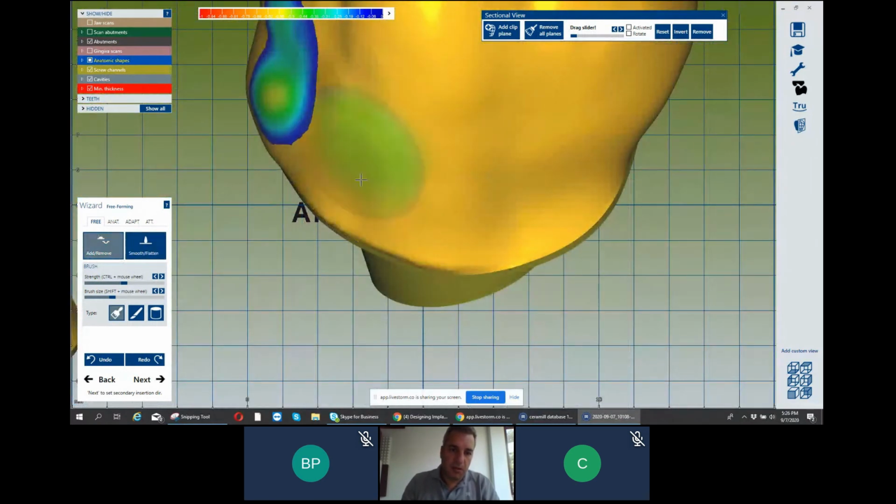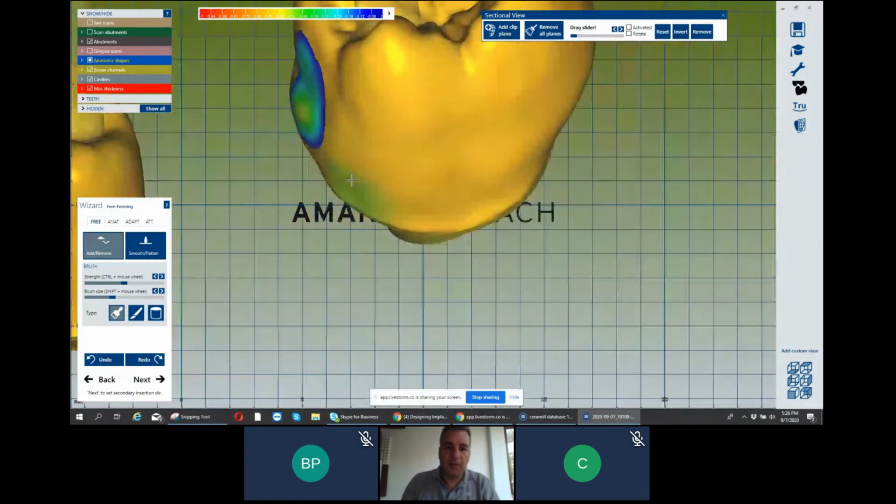So like this. I am designing just to show you the abutment later on.